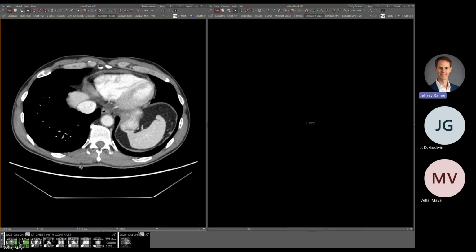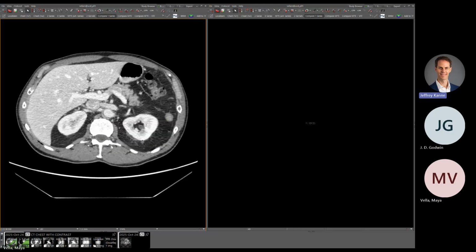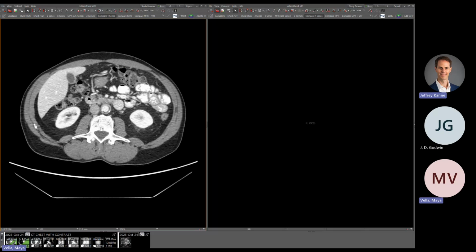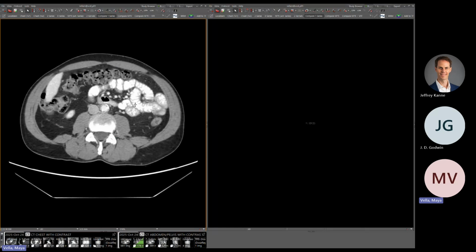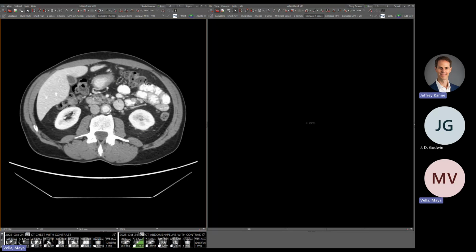Wow. That is a really nice case. Yeah. Usually, the ones I've seen are usually more limited. Yours, it's just like the whole aorta, the branch vessels everywhere. Yeah. We also have the actual full abdomen, which I think honestly shows it really well too. Like all the way down. Yeah, look at that. Stops at the iliac. Right to the bifurcation.